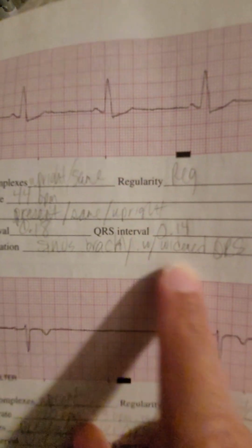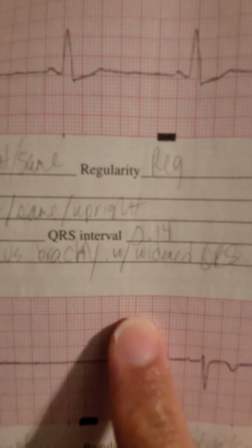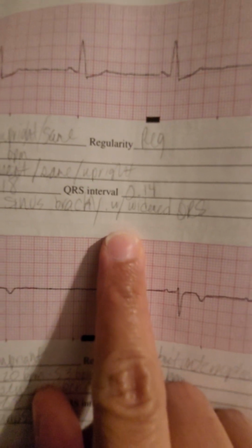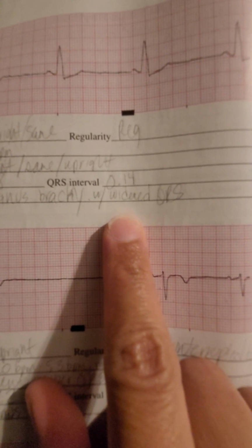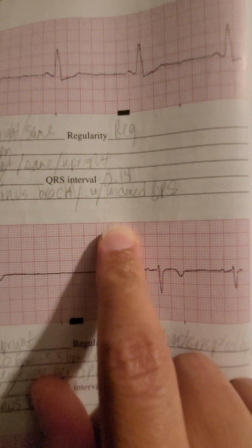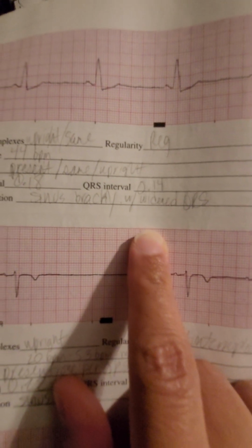That's still okay. You just have to mention it in the notes because it's still marching out. It's just a little bit wide. That is a sign of something that I might be getting later, and you have to let the nurses know. So you'd say sinus Brady with, depending on the place that you're working at, they might go for BBB, which means bundle branch block, or you'd say IVCD. I don't know exactly, depending on the place you'd be working at, they have different ways of calling it.